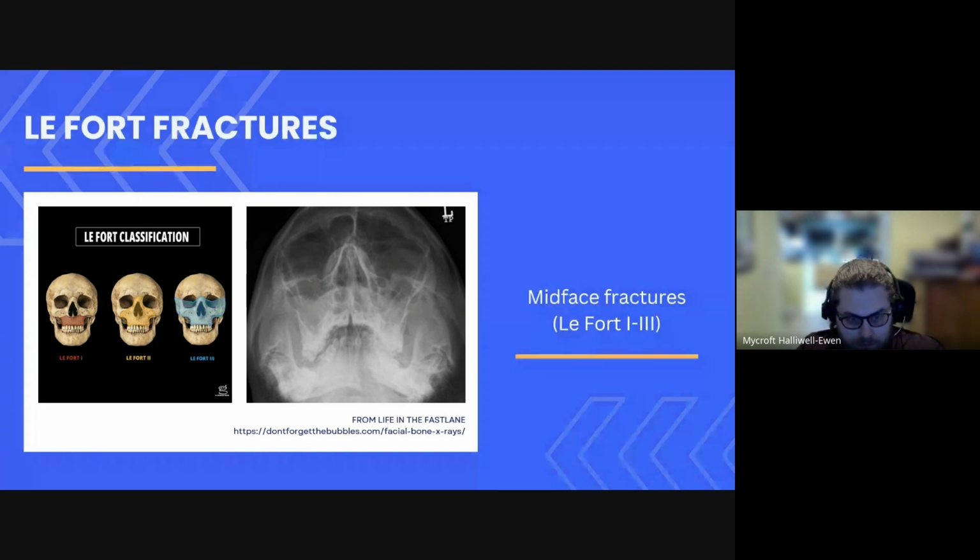So have a look at it, right? This is sort of a start, but the Le Fort fractures have very specific patterns, and they tend to, for example, in particular, say the Le Fort 2, it will fracture through the infraorbital foramen because it's a weak point, and it follows these weak points. So you get these maintained, constant fracture patterns.